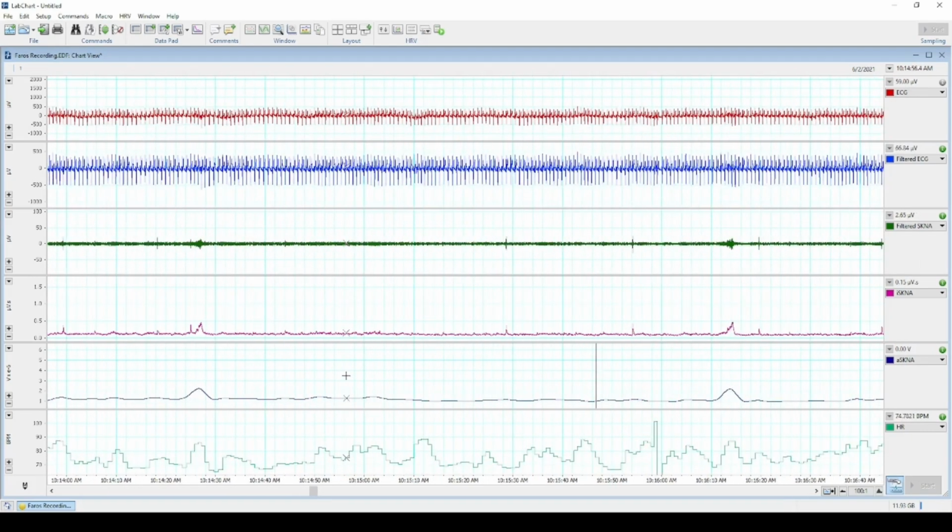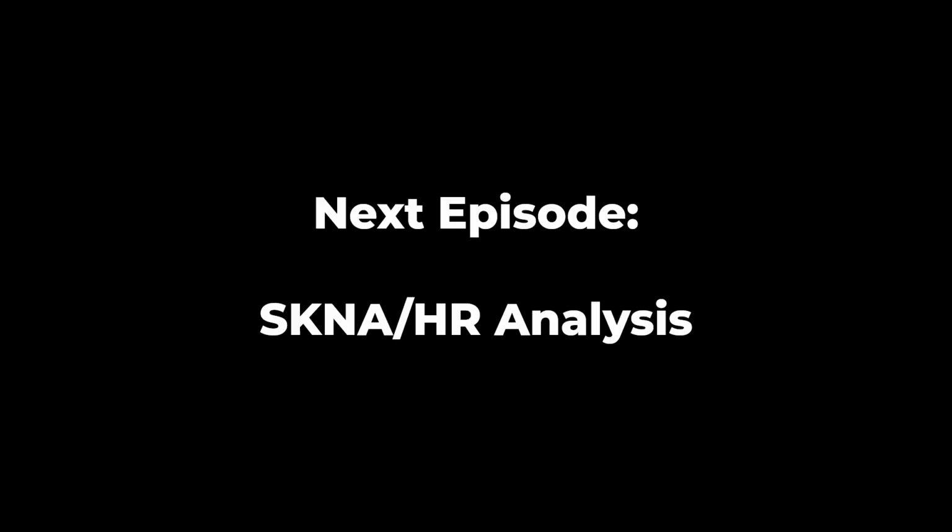You could do this step after setting up all the channel settings, or you could do this step before setting up all the channel settings. It's up to you. So that's how you set up Labchart Pro.